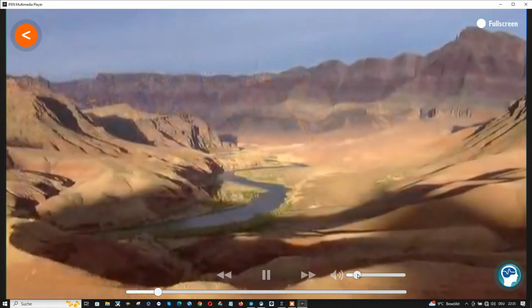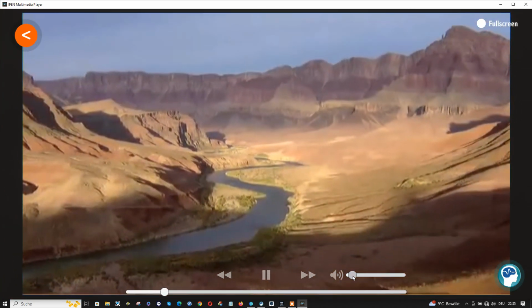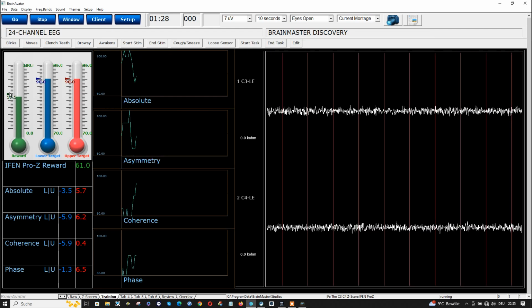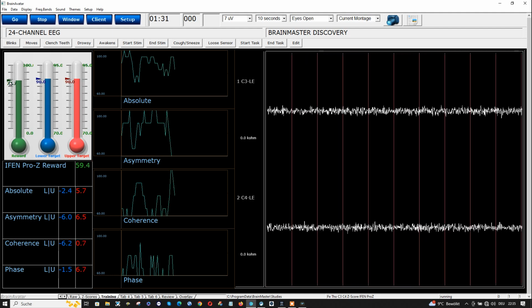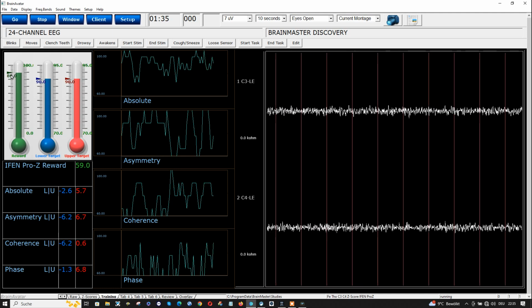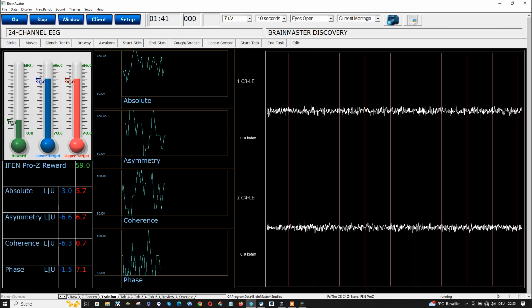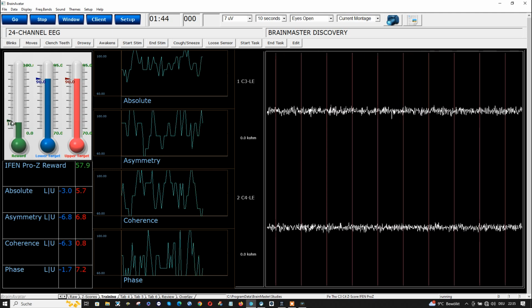And we can also eliminate sounds here if you like. And in the settings we can decrease or increase the difficulty level. This makes difficulty easier because we give more reward, and by clicking on the left mouse button and pulling that arrow down, we'll get less reward. Alright, that's all.